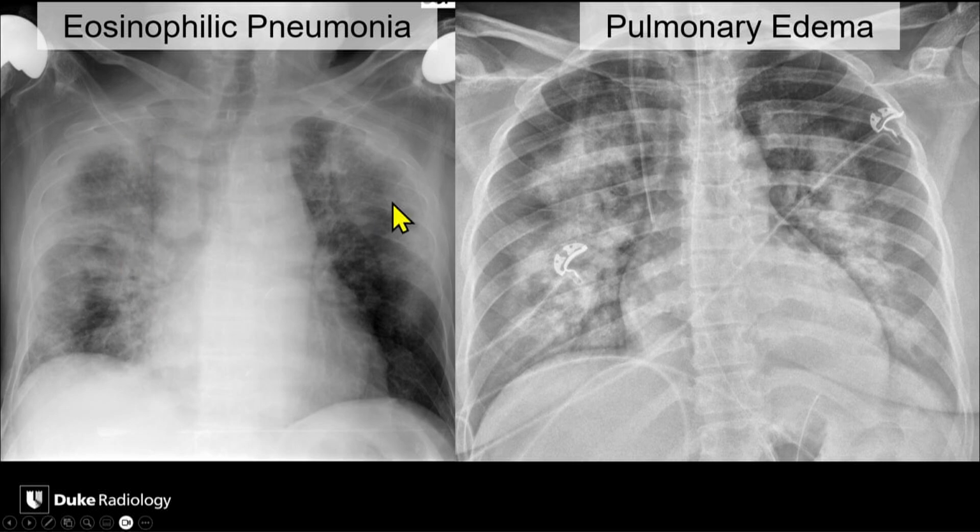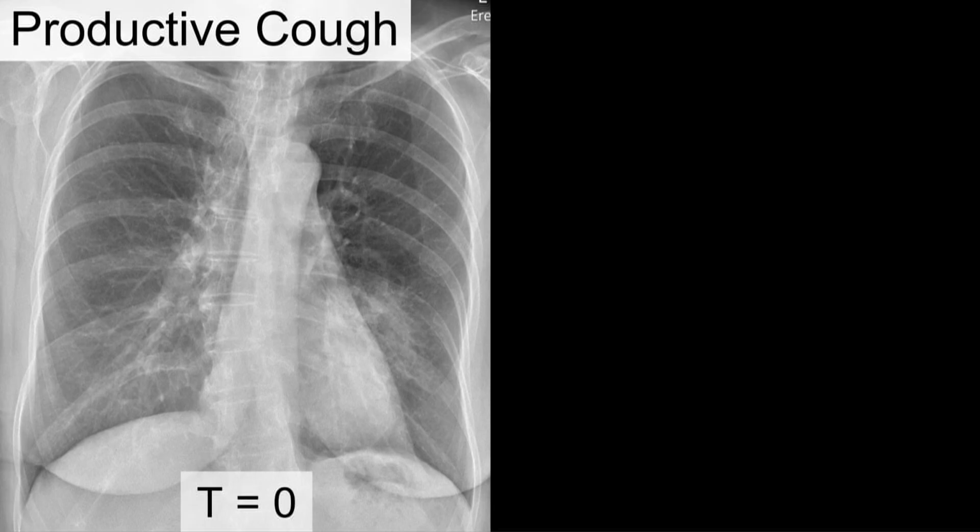This is sort of the reverse batwing or reverse pulmonary edema. Here's a patient with batwing edema. For contrast, this is the exact reverse or photographic negative, if you will, of pulmonary edema.